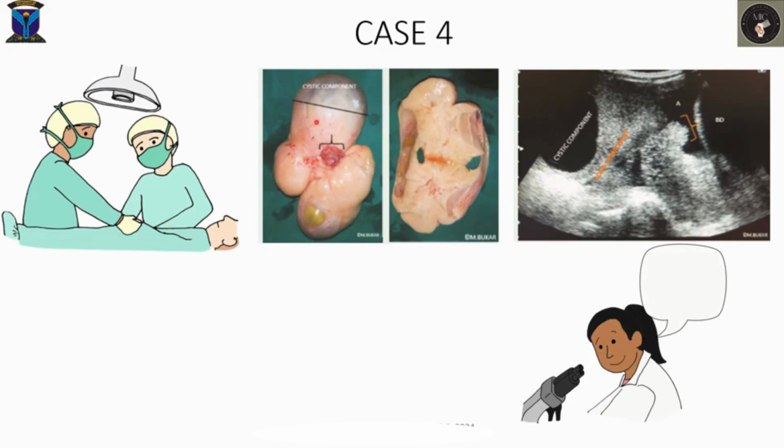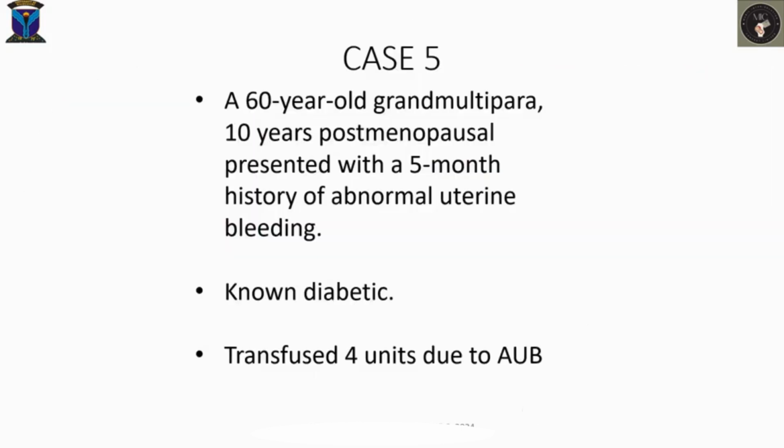She had surgery, but if you look at this mass, it's not looking malignant, right? So histological diagnosis was a fibroma. So you can see that in this case, the ADNEX model misclassified the benign lesion as malignant, probably because of the presence of ascites.